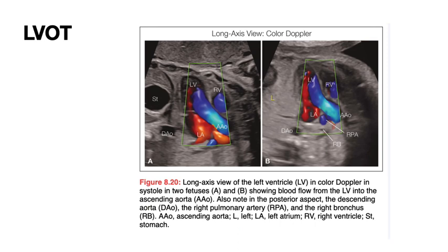All right, here we are with the same exact view, and we've got some color here. The thing to look at here, that I've seen from some of the test questions, is that clearly that's the LVOT, so then you can figure out that must be the left ventricle too. And usually, since you know that the mitral and aortic valves are close together, that must be the left atrium right nearby. So yes, there you see the whole LV inflow and outflow in one picture.